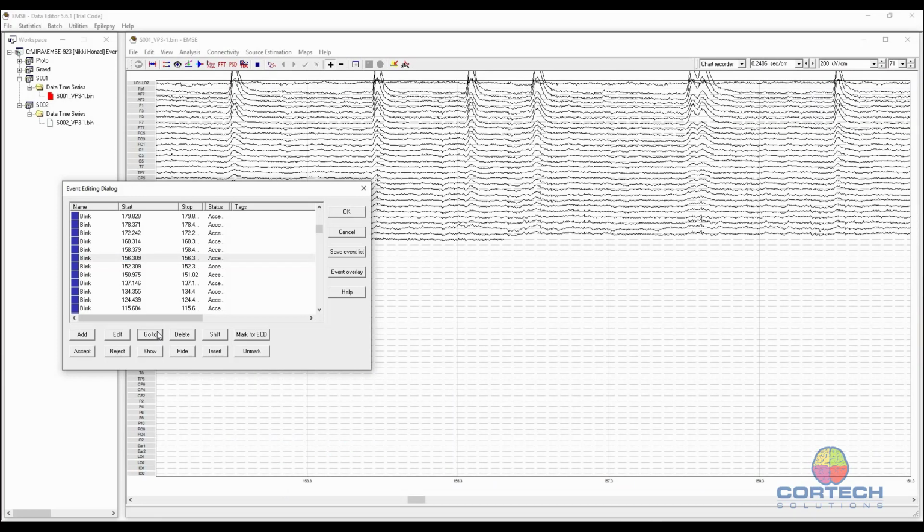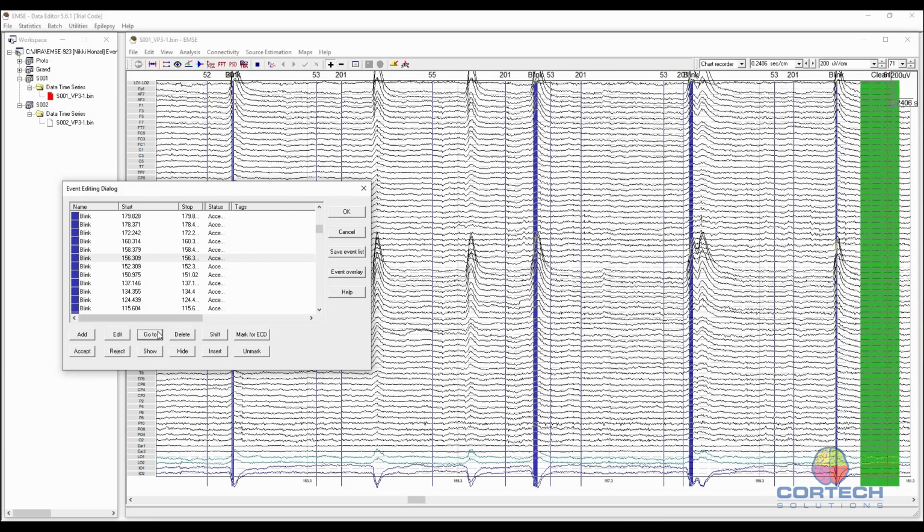And if you look at all of them, it's pretty clear that they're all blinks, even though we haven't selected all of them. This one here, for example, one of the criteria is that we're not going to have another blink. We're not going to select this blink because this other one is overlapping. But there are other reasons why these other blinks weren't selected, which has to do with criteria of artifacts on other channels, basically. And those things can be tweaked, but I'll show you how this one works.